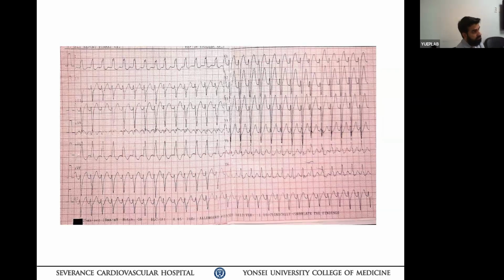Okay, and which findings are against VT? It's not a typical LBBB pattern, not broad. And the intrinsic deflection time is pretty sharp, right? Okay. Another comment?